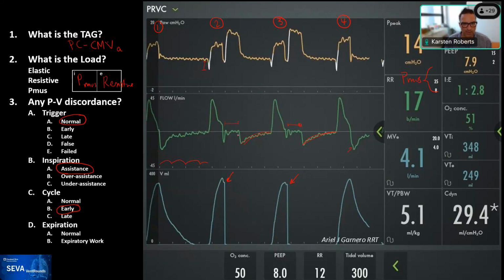Yeah, so I think that this goes back to the simulations that you showed at the beginning, where we see that the patient could actually continue to take a breath through the beginning of the expiratory cycle. So is the patient continuing to, like, they started, I guess the question is, where did the breath end? Where did the patient's effort end?